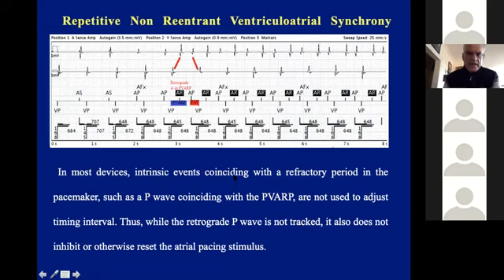This is a clinical example, and in this particular case, an old algorithm was present. It has since been debunked and is not used anymore. It's AFX, atrial overdrive pacing that was believed to suppress atrial fibrillation. In reality, it was actually triggering atrial fibrillation by promoting competitive atrial pacing. So here we have V-pace, V-pace, and then after the V-paced event, there is retrograde conduction in the refractory period, and then atrial pacing because of that.